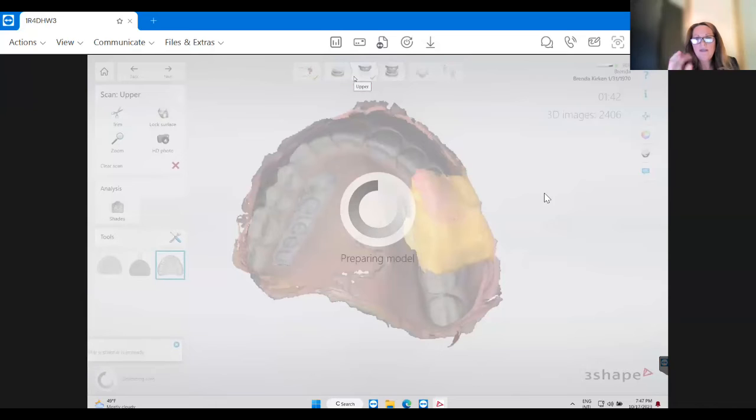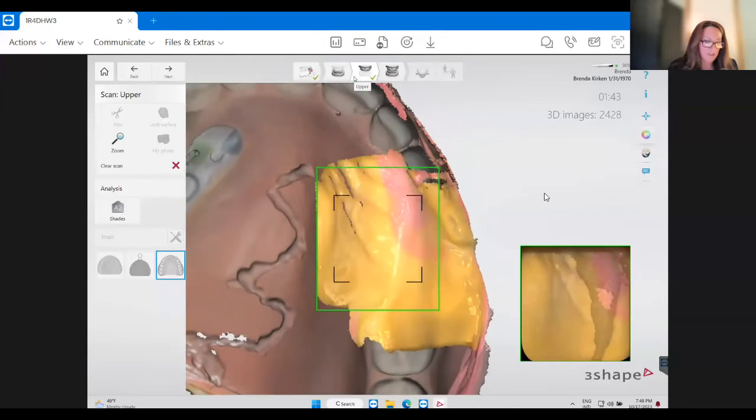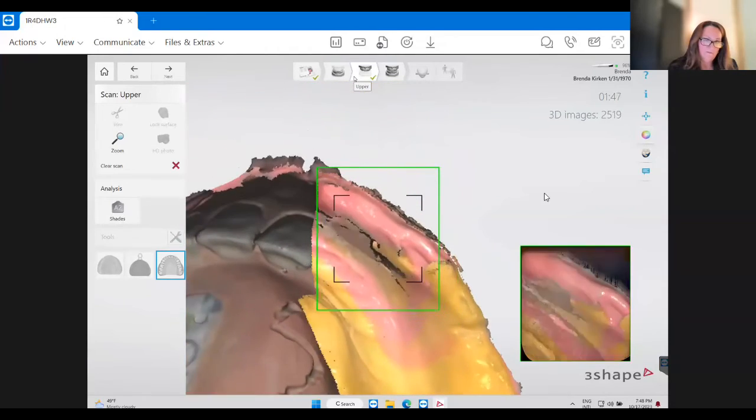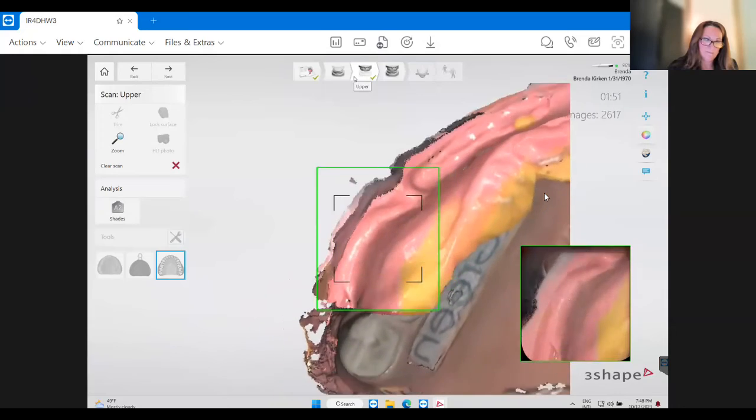And you should not be... Kelly turned off her video because sometimes when we're scanning, if there's too many people on the video, then it will do that little hopping and jumping that you saw, where little lines. Okay, so now that I have that into the intaglio, I am going to finish up scanning on the inside.